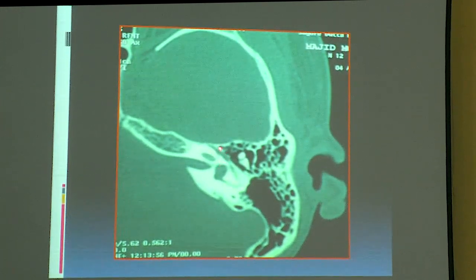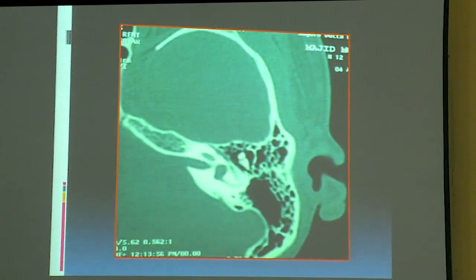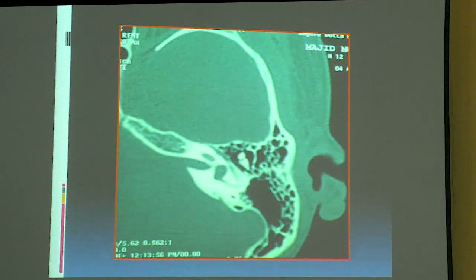And as you have traversed the horizontal facial nerve, you begin to see the cochlea, the uppermost part of the basal turn of the cochlea. Cochlea has 2.5 or 2 3/4 turn, and the basal turn has a superior basal turn, the middle basal turn, the lower basal turn, and then it goes on and becomes the middle turn, right?